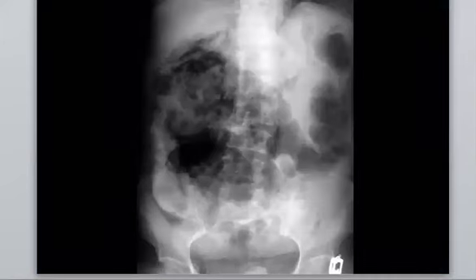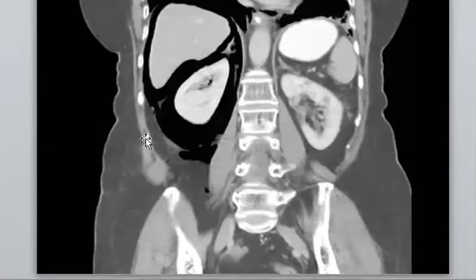So it can happen with trauma, inflammatory disease of retroperitoneum, gas producing organisms. So they have three spaces, which is the perirenal space, and in the axial you can see the anterior pararenal and posterior pararenal.